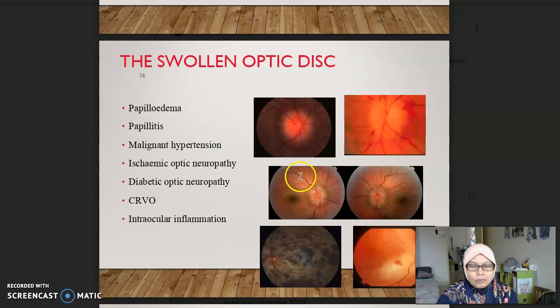Is it 2:3? And then you go to the color of the retina. It looks normal. This black dot is the macula. The macula is normal; it's normal to be dark like that.